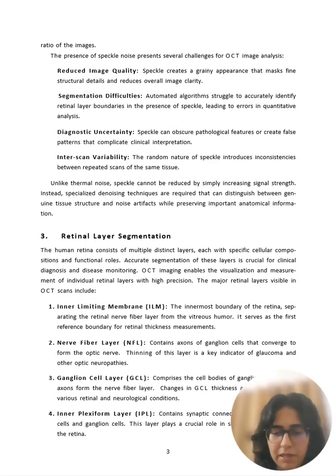So because of speckle noise, image quality is reduced and overall image clarity and structural details are lost. There are segmentation difficulties between different layers of the retina, which leads to diagnostic uncertainty, which makes it hard for clinicians to understand the pattern or can lead to false positives.